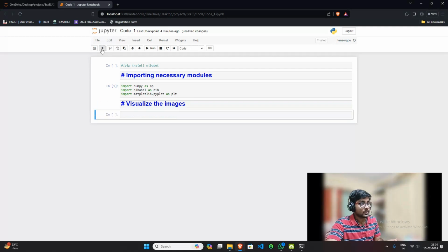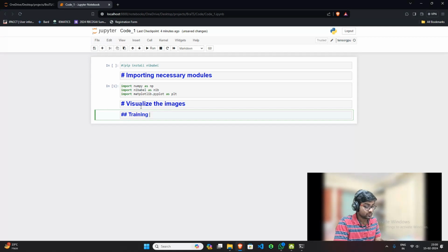So first, training path. First let's write path, just write path.